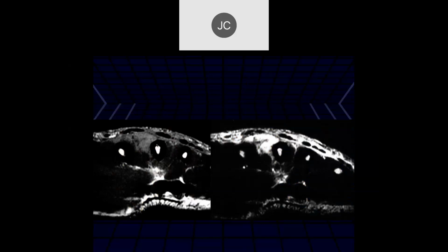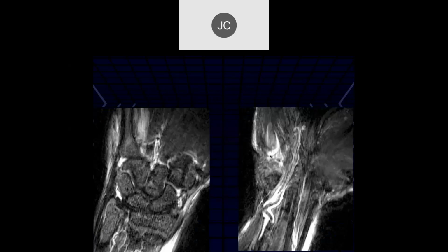Okay, Elior, what do you think of this case? Right, so here, this was deep to the trauma. Okay. Yeah, I see increased signal deep to the flexor tendons. Wait, the extensor tendon here, right? Yes, I'm sorry, extensor. Okay, so you're talking about this area right in here. Yes. Okay. Yeah, and this turned out to be a tear of one of the muscles. Okay. Yeah, big surprise.